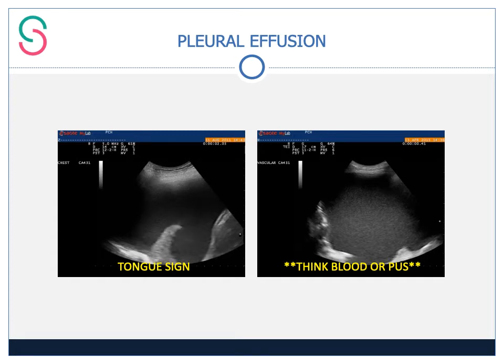There are a lot of features of pleural effusions which could be discussed, but keeping it fairly straightforward for the purposes of this presentation, a pleural effusion is typically hypoechoic, a dark area. The darker the fluid looks on ultrasound, the more likely it is to be lacking in cellularity and protein content. But you cannot say that if something is completely anechoic or completely black, that it's a transudate. It could still be an exudate.